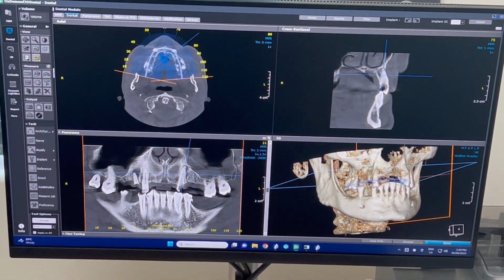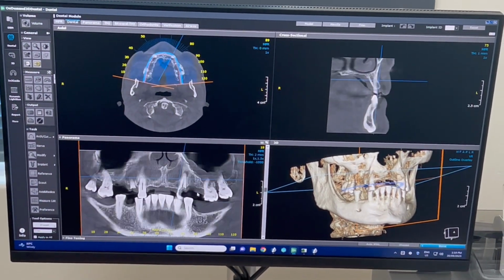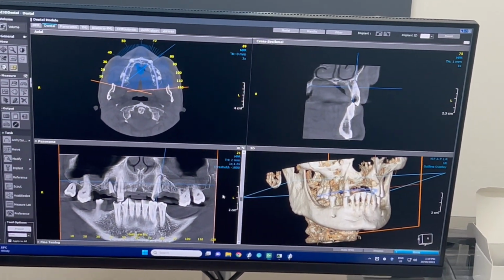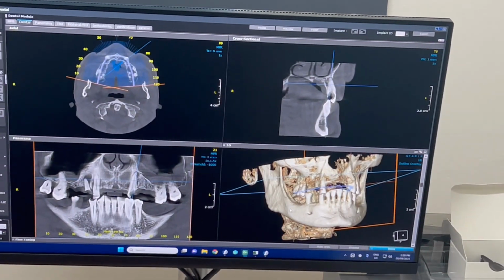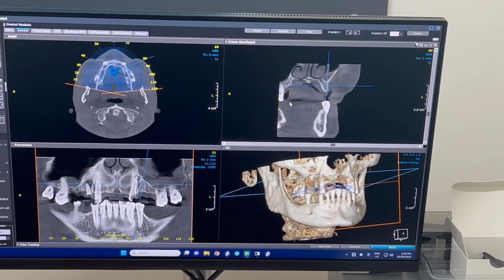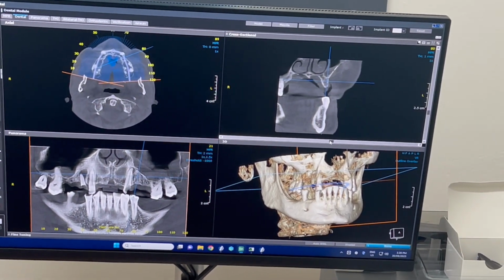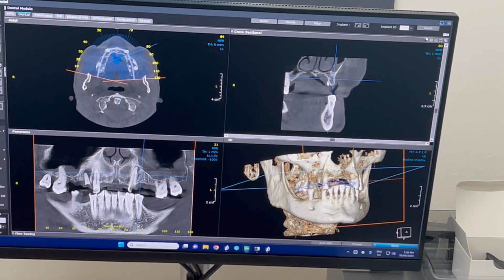The next thing the gentleman asked me was, what's the long-term future if I don't particularly like wearing a denture? I said, well, you've got a lot of bone there, which in the long term you could possibly think of implant therapy. On the lower jaw, you could likewise, he's got lots of options. Let's just pretend I showed the gentleman, say around that 2-4 area, what the situation would be if you put an implant in there. So you can see it's a bit limited.